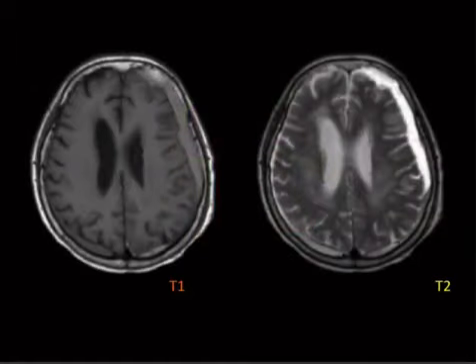Okay, next point here. This is very high yield and a confusing thing. I'm going to make an effort to explain it. So we've got a T1 and a T2, both showing a subdural collection of blood, and the question is going to be, when did this happen? So you've been hired by the forensic team to date the injury, and they want to know exactly how many hours ago this person had an injury.